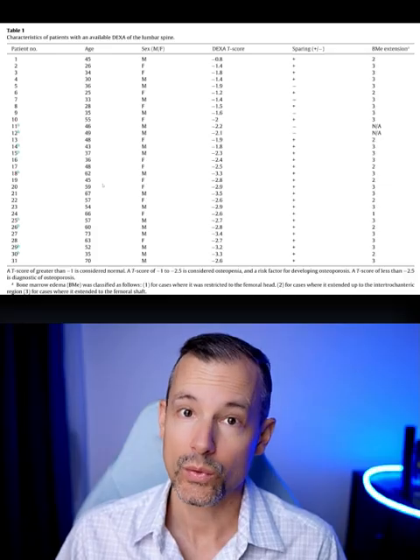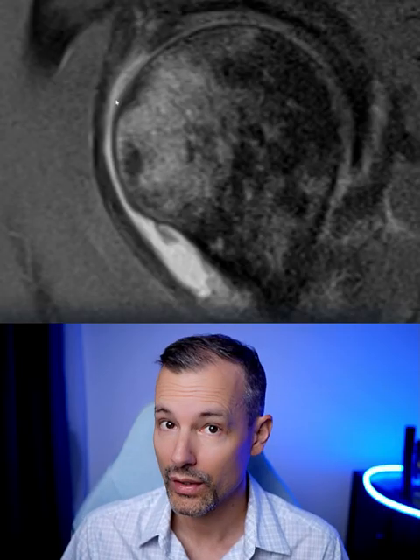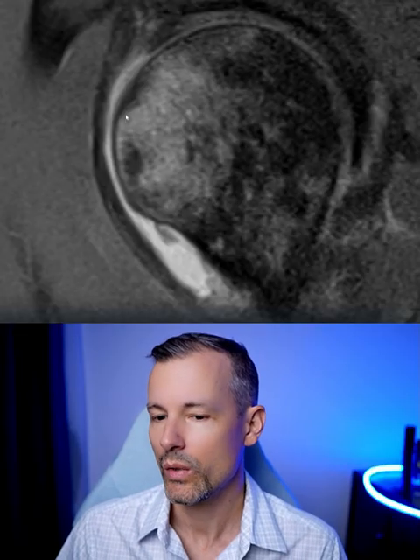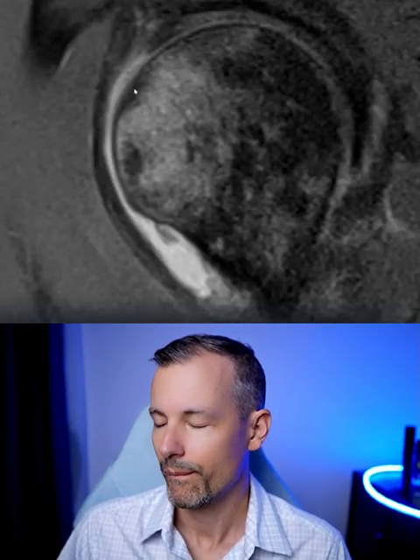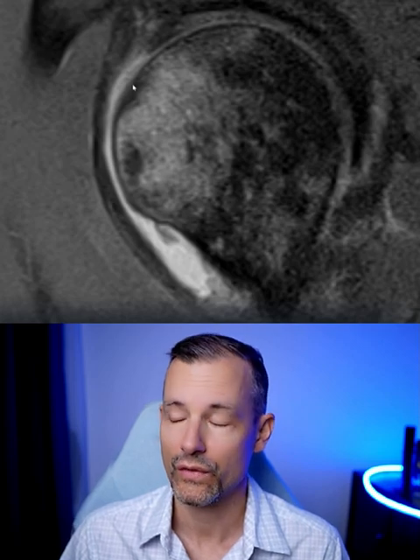And that's the term I'm using, especially as soon as I see a fracture line or something irregular at the subchondral region. I go straight for the subchondral insufficiency fracture, and I don't have to worry about the term transient osteoporosis or transient bone marrow edema syndrome, which I think is going to be replaced anytime soon. Anyways, now this is just my personal opinion. Similar to the knee, where we don't use spontaneous osteonecrosis of the knee anymore, we just go straight for the subchondral insufficiency fracture.